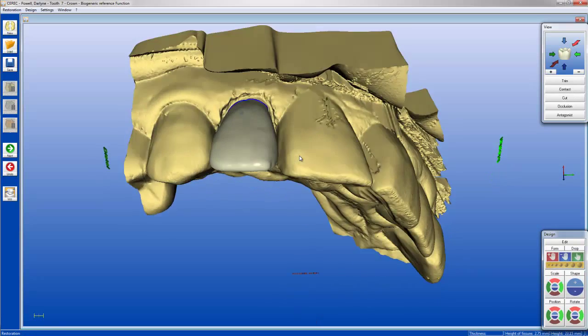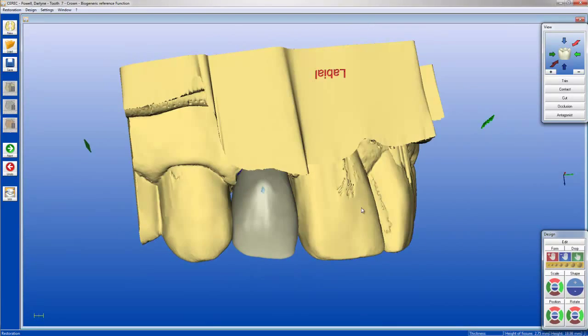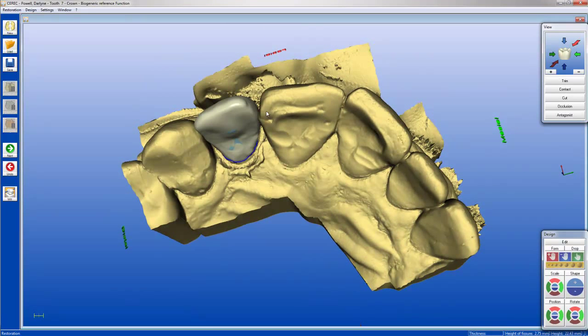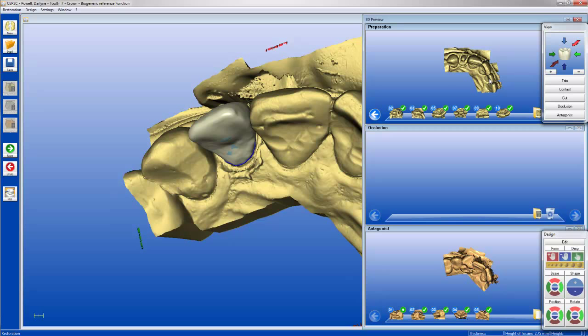And what I think was causing the problem was just a lot of images, a lot of shaking images, and it was causing the proposal to get backwards because the images were confusing the software. So to recap, minimize your images so you don't get distortion. You don't have to flip the camera at the midline, and you don't need anything in the occlusion window right here if what you're trying to reference is in your preparation window.